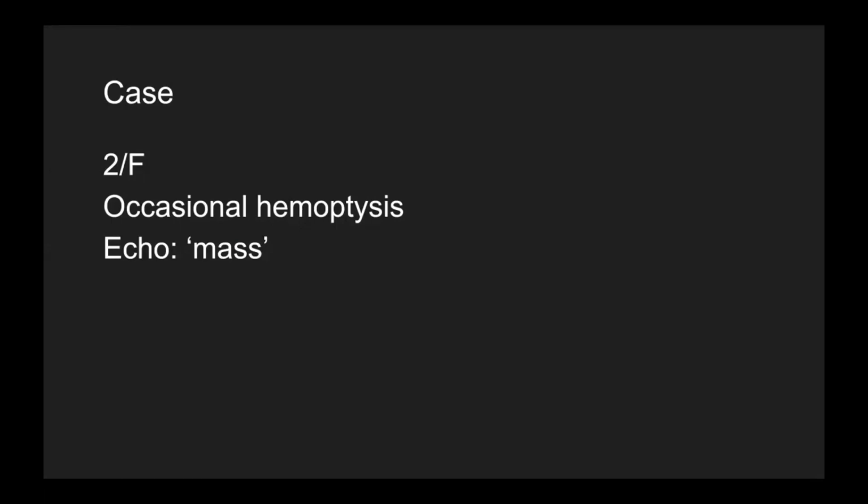Now, when we see such mediastinal soft tissue in a child, the challenge is to differentiate between a lymphoma versus mediastinal fibrosis. Diffusion weighted images can help in this situation, and also the pattern of enhancement and extreme T2 hypointensity are in favor of mediastinal fibrosis over lymphoma.